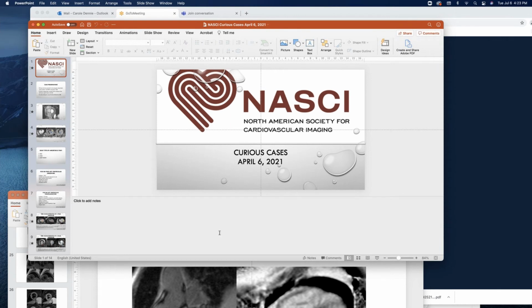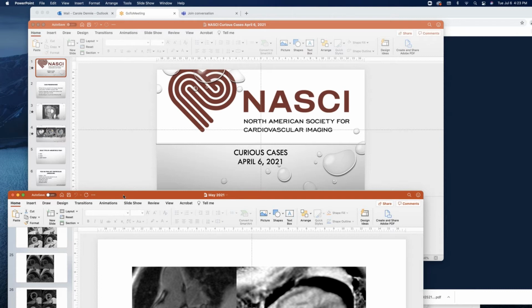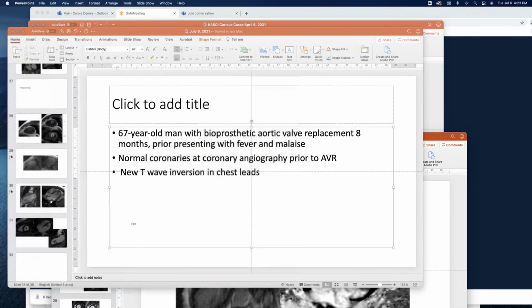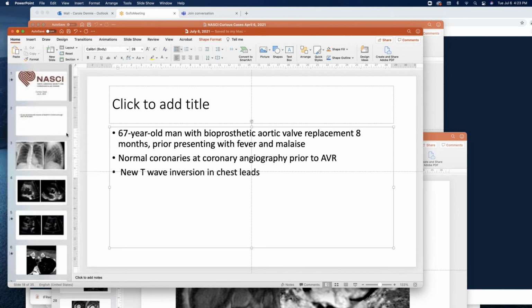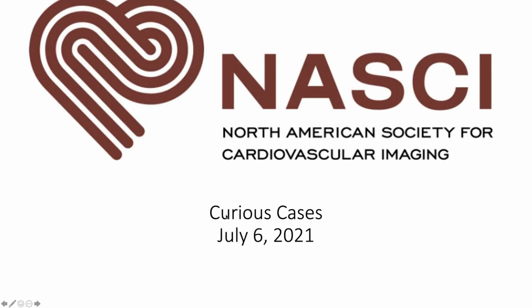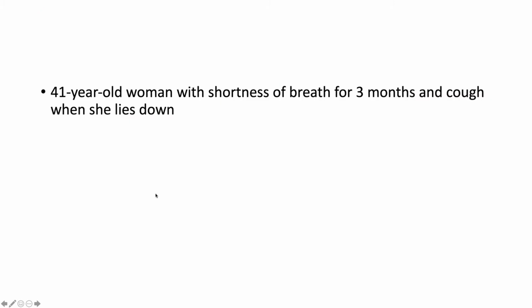It's pretty obvious. It's not one of those subtle ones, but subepicardial, extensive enhancement, and it temporally fits with administration of the second dose of COVID vaccine. In a 16-year-old, yes. Previously asymptomatic, 2 days after the second dose of vaccine.